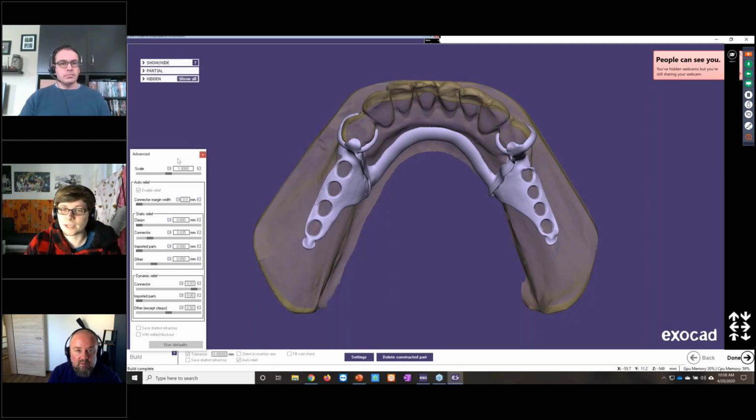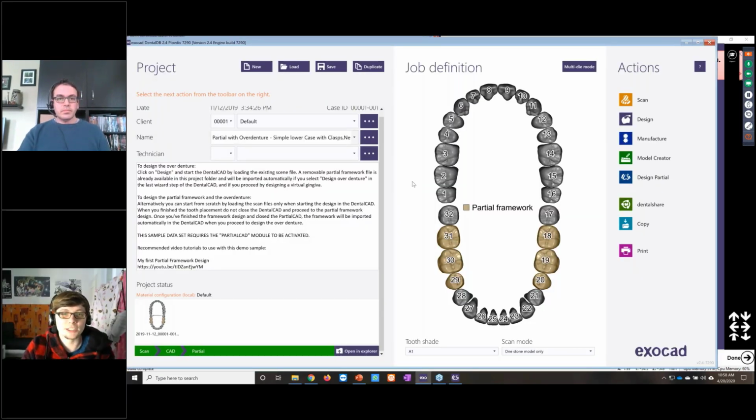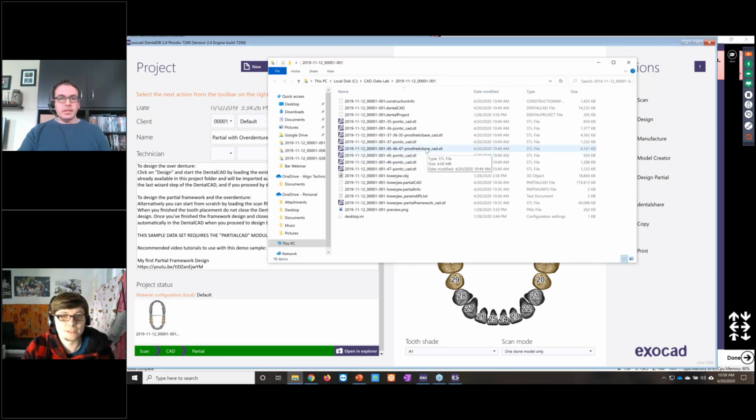So there was another question, or more like a request. One participant wanted to see again the gaps between the acrylic teeth and the gingiva and how this whole design looks in the end now. Oh, okay. We could probably do that by taking especially a look at the pockets in the gingiva themselves. Yeah, okay. So I'll open up one of our prosthetic-based STL files here, and we can point out some features here.